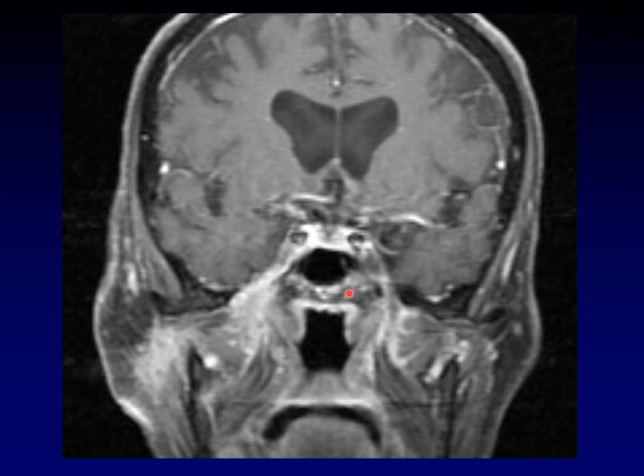Be sure you know what the normal side looks like so that you don't accidentally call all of this venous enhancement perineural spread.